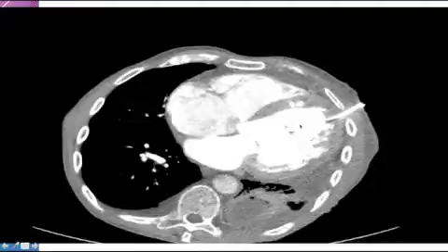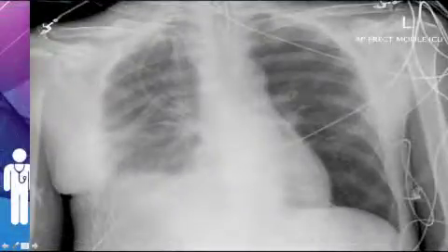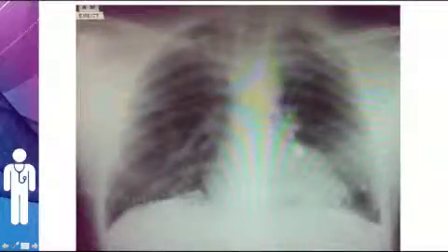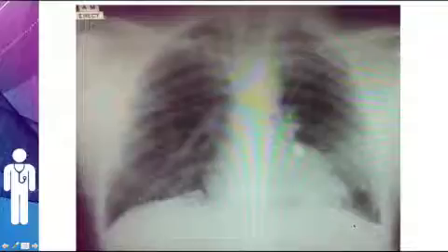This one's sitting in the left ventricle. You need to leave that one in. This one's an empyema with multiple tubes, some of which are kinked. Also a central line coming in and an endotracheal tube. Here is a gunshot wound. There's a bullet here. There's various monitoring, a recent thoracotomy, and a bunch of chest tubes in the chest as well as a splenic drain. Patient's intubated and has a central line.